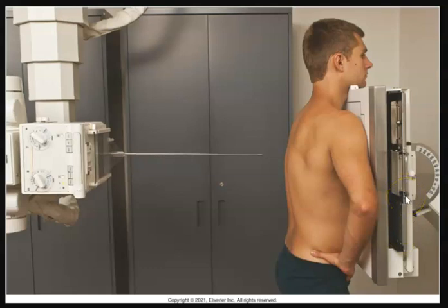I never forget that one of the newest words I'd ever heard in X-ray that they started throwing around immediately was the word bucky. So again, it's basically this entire mechanism here. It's what holds the IR, and there are also detectors in here and some different kind of shielding aspects. But this right here is the bucky, the X-ray tube, and then the central ray is going to be that centermost part of your X-ray beam coming out and heading toward the patient.